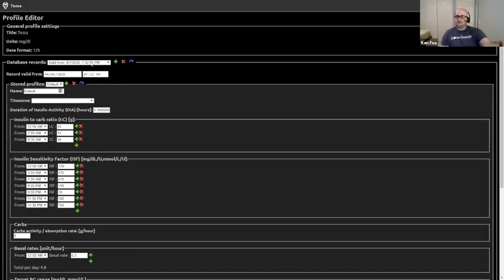So yeah, backups of your settings. Again, it's not all settings. It's not your max bolus and basal and things like that, or overrides. But if something happens and your phone gets erased or your Loop app gets deleted or whatever, you have access to a backup of your settings to some degree, which is super useful. Also really great now that it does this because it's much easier to help people with their settings. If they give you their Nightscout site, now I can go in and look at what their settings are. So it was more abstract before, so much nicer.